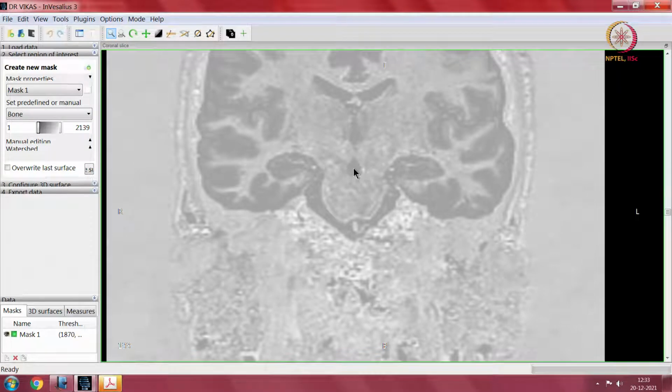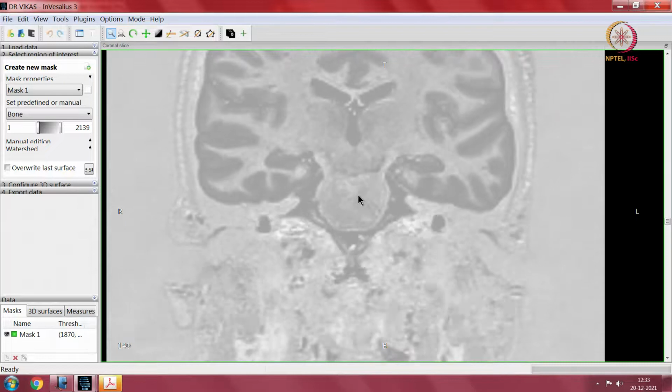So, when we come anterior to that, this would be the aqueduct, third ventricle and lateral ventricle. So, we see a lot of structures in this. This is the lateral ventricle, again cut section, please remember, this is the third ventricle, and lower down is the aqueduct, which is connecting with the fourth ventricle.